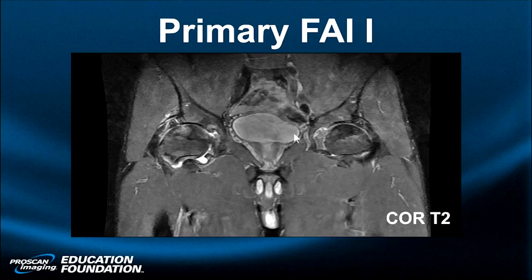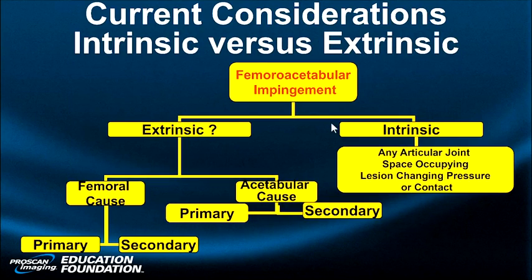Look at his MR. He is attempting to keep the hip in place by hypertrophying the acetabulum, but it didn't work. He broke this ossicle and labrum on the right. He's stripping the capsule. He's developed an extra-articular paralabral cyst. He's got an effusion. He's got a pistol grip deformity. He's not symptomatic on this side, even though it looks almost equally as bad, but he will be.